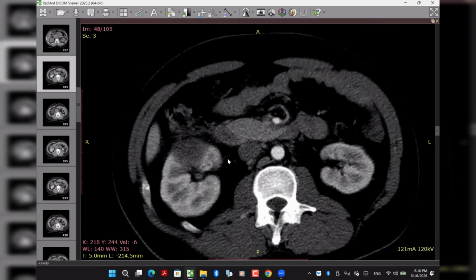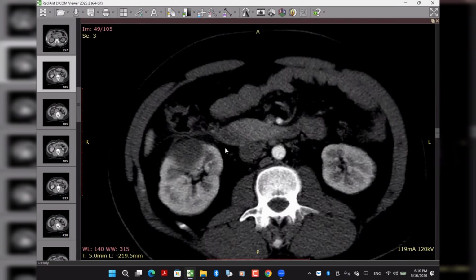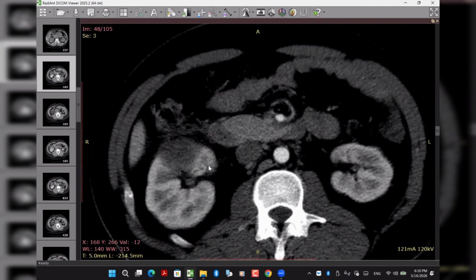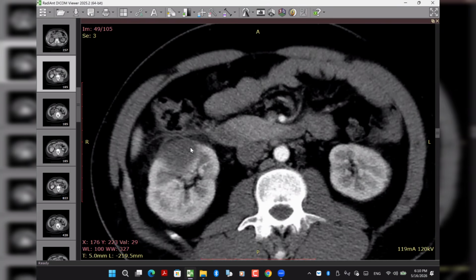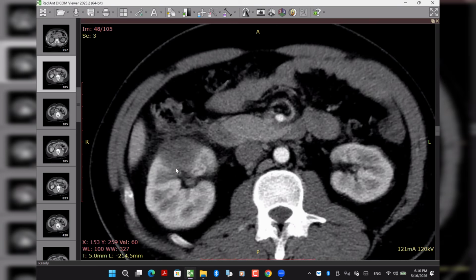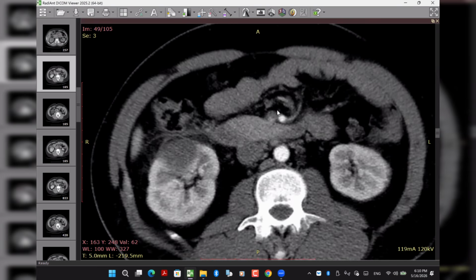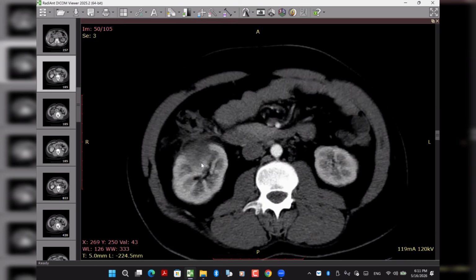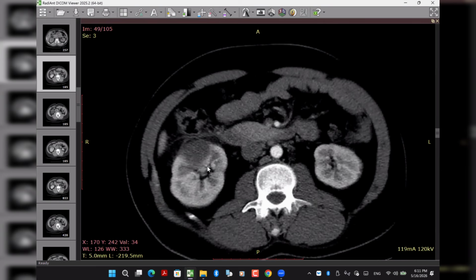Excellent. Yes, actually, he had my same mindset. He put an excellent demonstration, but it was here, on this area. So the moment you see an infectious process like this one, as Dr. Muhammad stated, and you see a focal area of hypo-enhancement that is persistent here, and you didn't have the courage to see it is cystic and this is abscess. So this is the stage of the lobar nephronia.